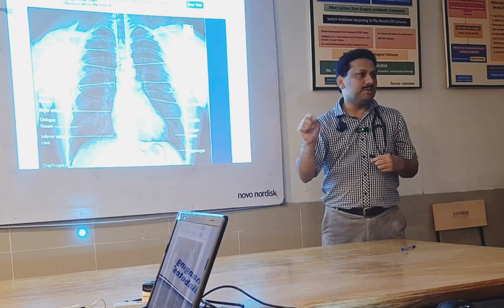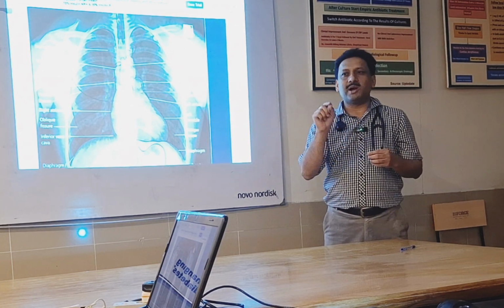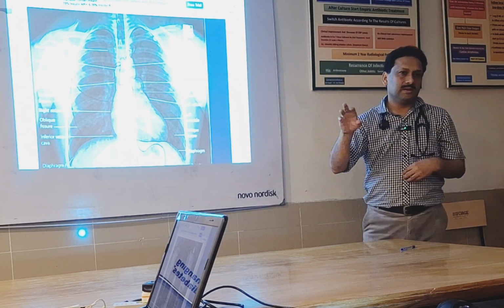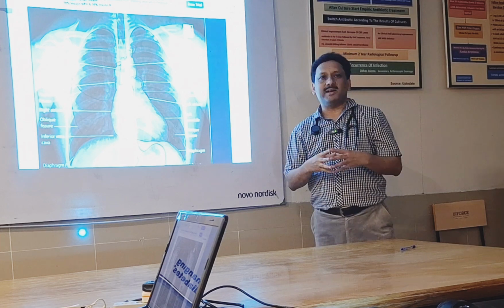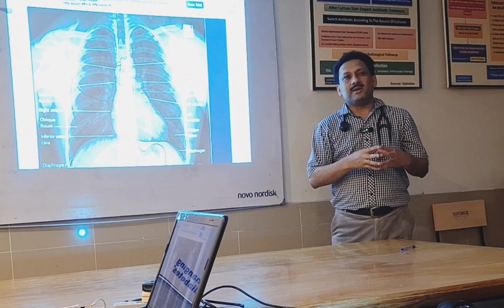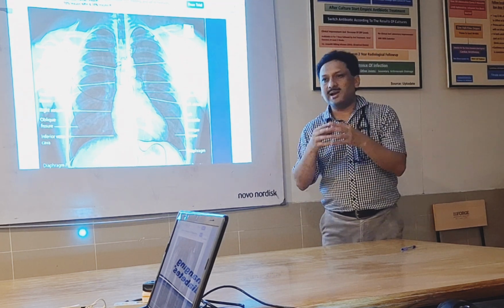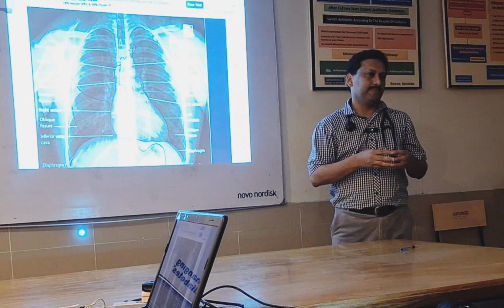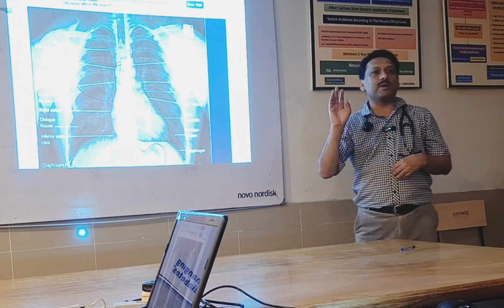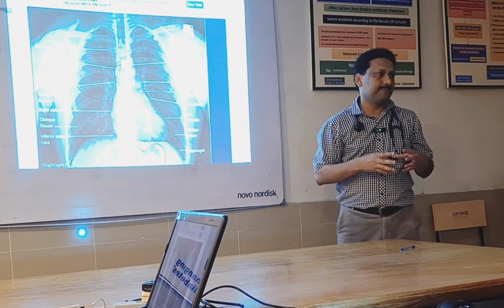The techniques which we use, the technical details which you are going to see before you comment on the problems you identify on the X-rays, that's the most important thing you need to focus on first. Never ever comment on an X-ray before you are well aware of the technical details. To remember these technical details, remember a mnemonic with the name PREV: P, R, E and V.